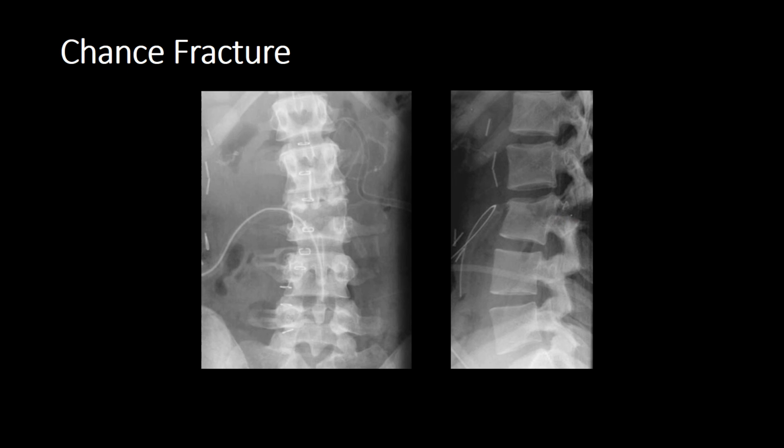So let's look at it on the AP view. So we start off going around our vertebral bodies, and we can see that there is slight loss of vertebral body height in relation to L2 and L4, but not much, only a little. Now let's look at our pedicles.